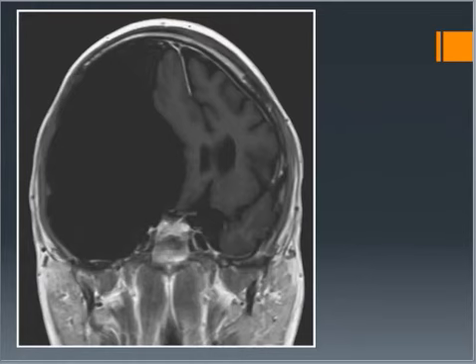This is a coronal slice of the brain. This could be a couple things. I can't say 100% without having additional views, but it could be fluid. Remember, on a T2 scan, fluid is black, or I'm sorry, a T1. And then it could also be a tumor with fluid around it. As you can see here, there's that midline of the brain, and see how it's pushing it all over due to whatever it is, if it's the fluid or the mass in there.